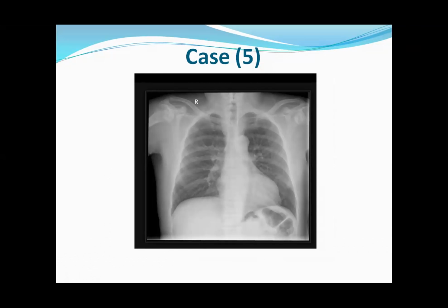This is a radiograph of chest, in which the lung parenchyma appears to be grossly normal. No radiopacities are noted. I'm going through the review areas. The apices appear to be normal. There are no retrocardiac opacities. The cardiomediastinal margins also appear to be normal. This is a 20-year-old male who came with acute chest pain.